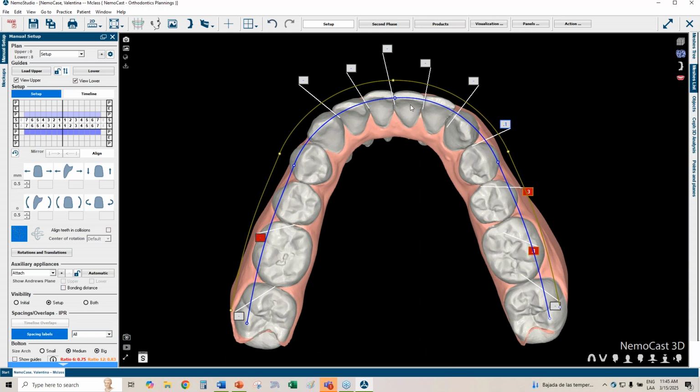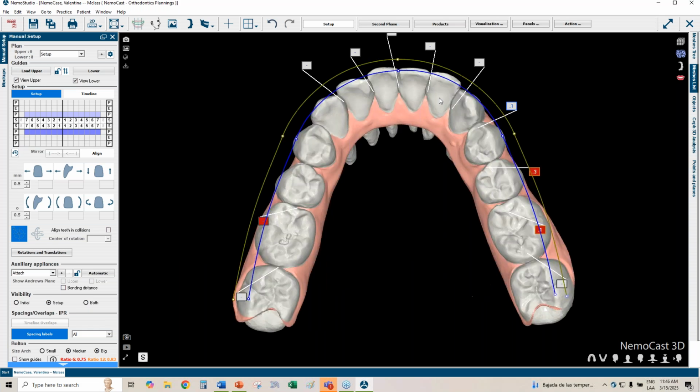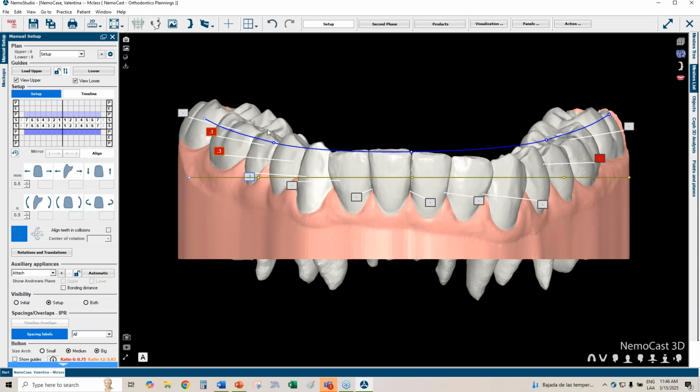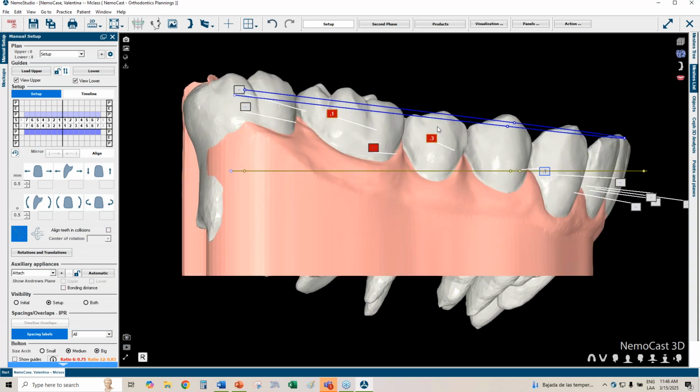So finally, to get a full line of work, we need to adjust this line to our actual parameters. So we cannot go further on the posterior segments, and we cannot go protrusive-wise outer than our incisors. Okay, so we know for a fact that the lower incisors are the ones that I'm going to keep. So I place the center of the parabola, moving the line on the center incisors. We already established we want to keep this curve of Spee as much as possible.